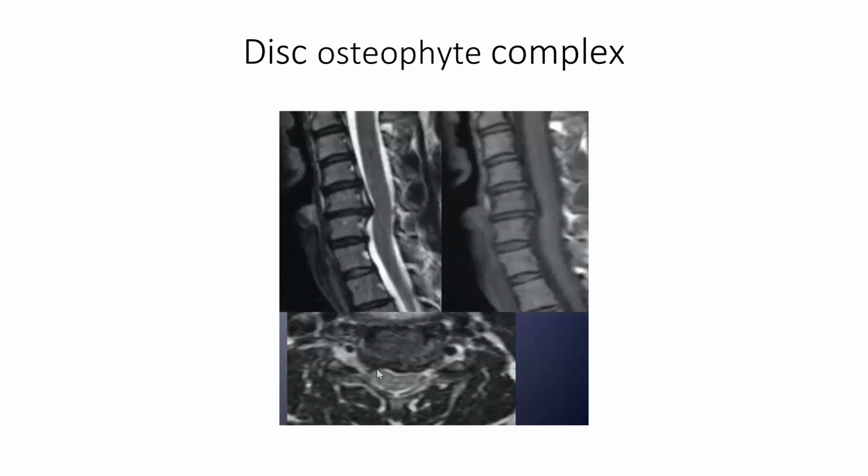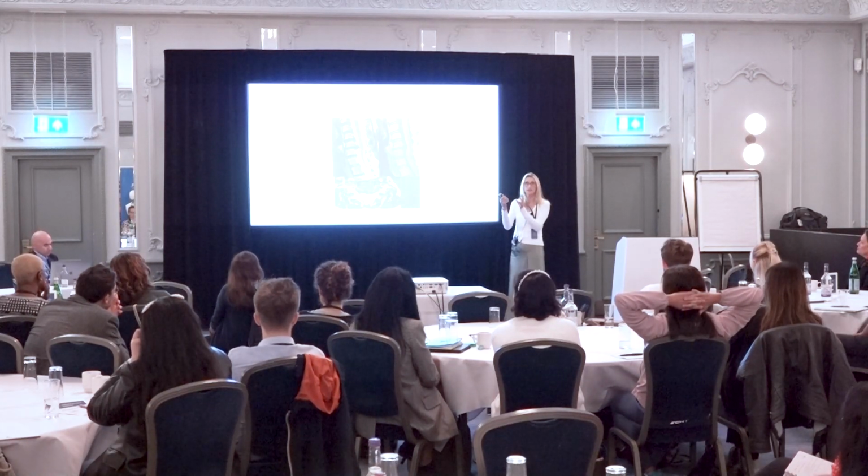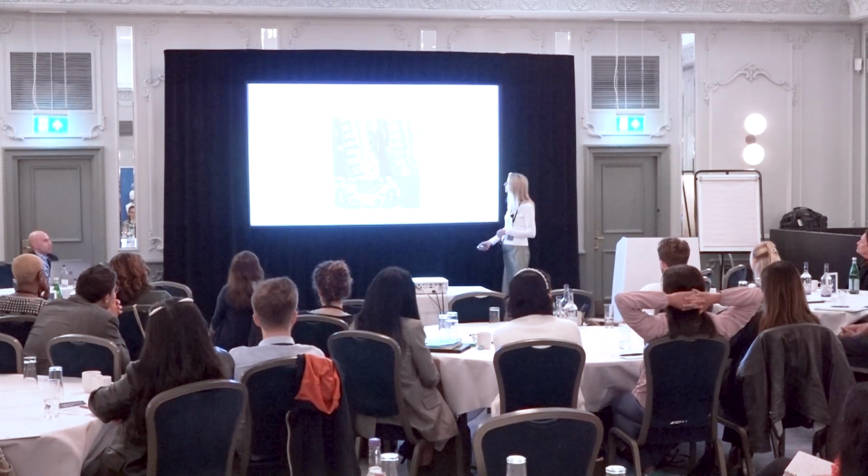These are the terms we use, and you can see that there's this chronic, partially calcified, partially ossified component coming back from the disc, which is usually a combination of disc and calcification or bone. And that's important because it's usually not soft. Apart from the cases when you get a very young person who presents with very acute symptoms, and we see an edematous disc as we do in the lumbar spine, most of them are combinations of the two.